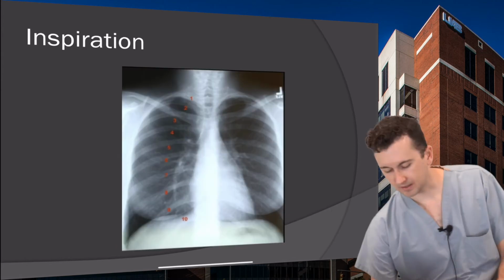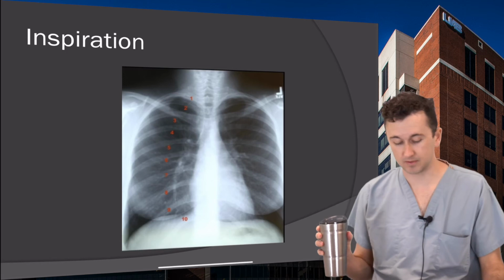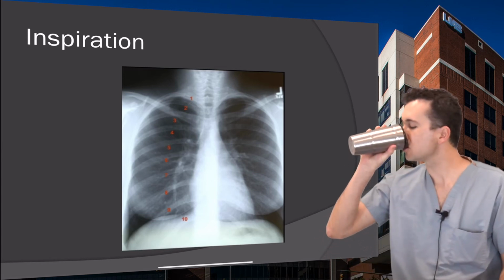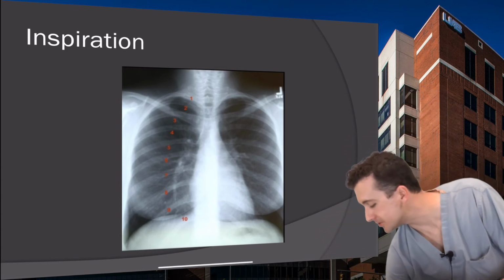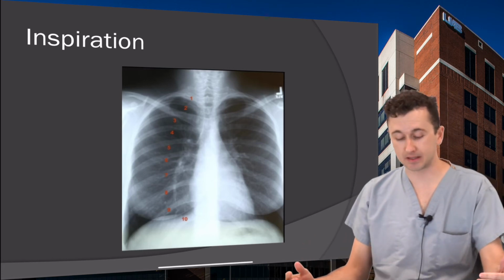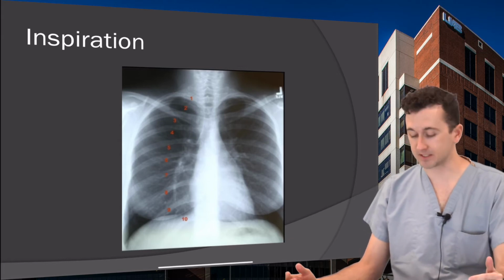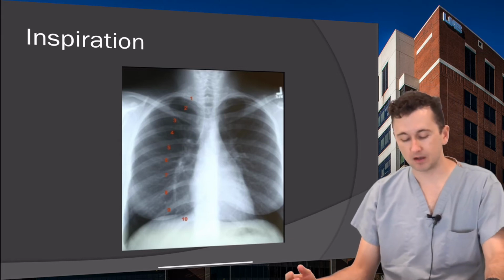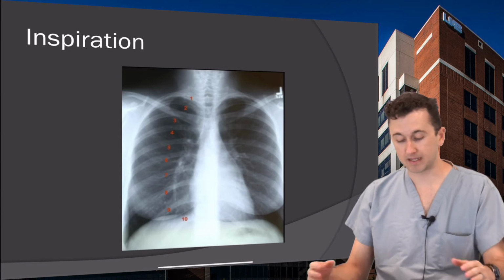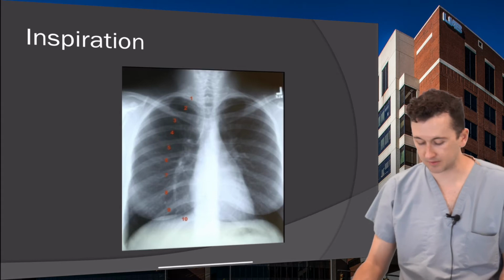All right, so the next thing that we need to evaluate when it comes to the technical quality of the film is inspiration. And this refers to if the patient or the film is timed at the proper moment in the respiratory cycle, and so you want to capture the film at the moment the patient has maximum inhalation, so it expands everything.